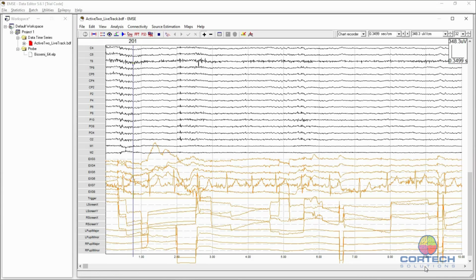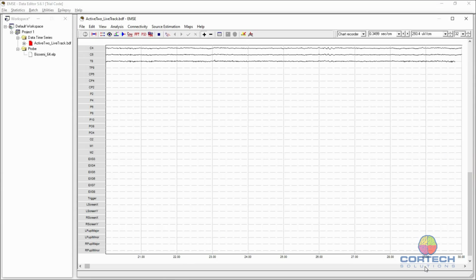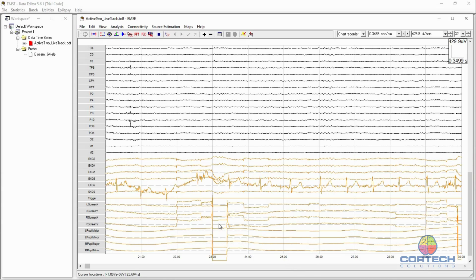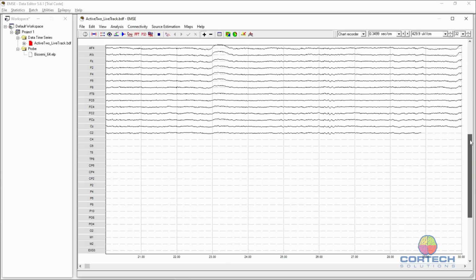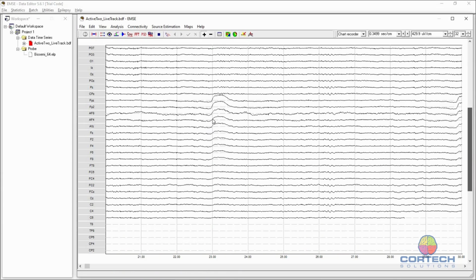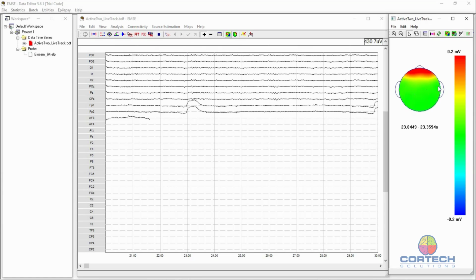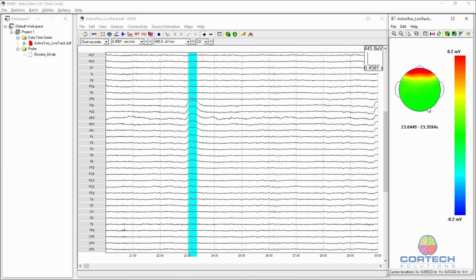This is very similar to what we looked at before in more detail. From what we saw previously, we expect these periods of time to correspond to blinks. So let's move up here and see, indeed, we see a blink there. We see blinks there. These are frontal channels. Let's just quickly map it. Since we have our probe, indeed we see a blink frontal topography.